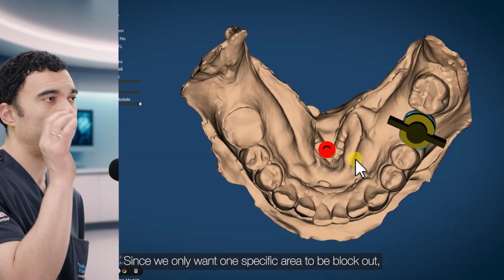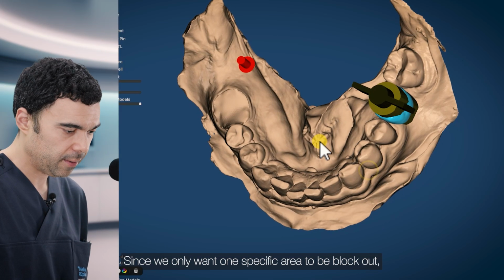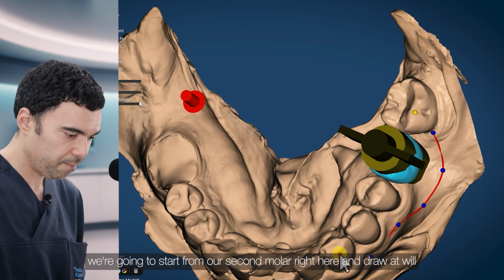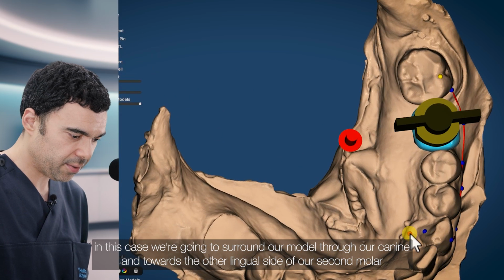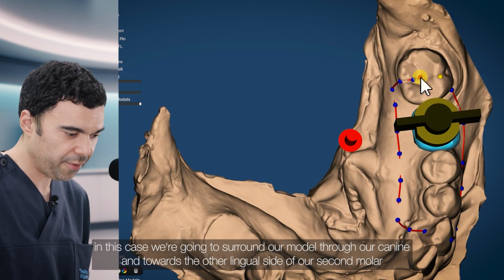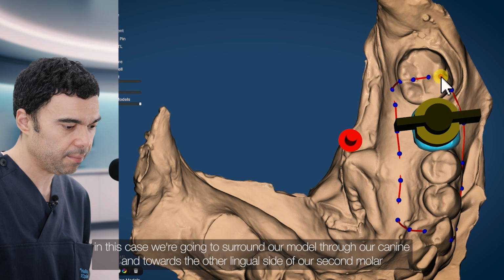Since we only want one specific area to be blocked out, we're gonna start from our second molar right here and draw at will. In this case, we're gonna surround our model through our canine and towards the other lingual side of our second molar.